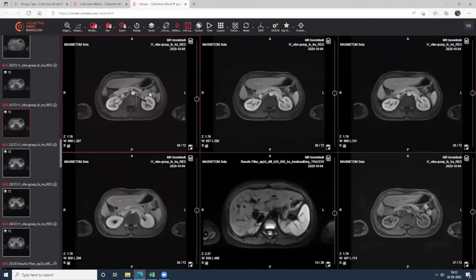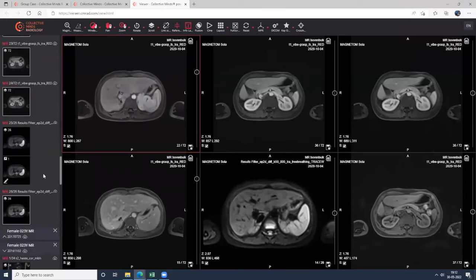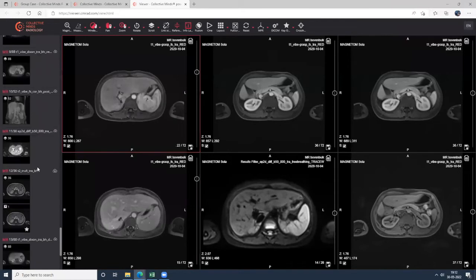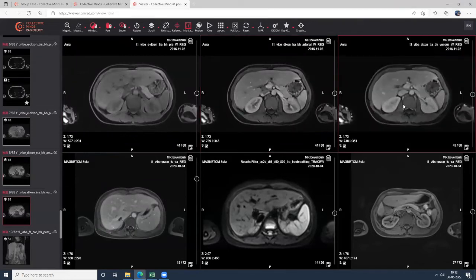So with that introduction, Johan, maybe can you introduce the case? Okay, it's case number 1. Number 1? Yeah, it's case number 1. Sorry, yes. Okay, I will go to the same case. So they can open it up in my review mode. Okay, here it is.